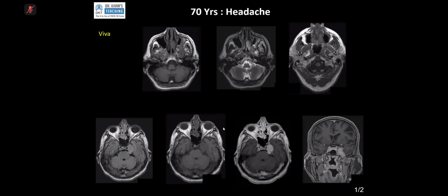And look at this example, which per se is a very good exam case, where you can see there is a bit of high signal on the FLAIR here in the masticator space compared to this. On post-contrast, even on pre-contrast, you can see there is soft tissue here. What is happening is that there is actually a schwannoma in this case.